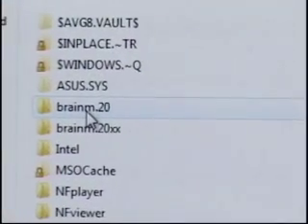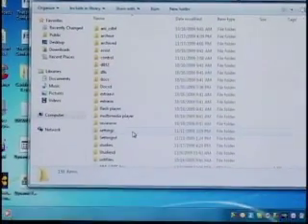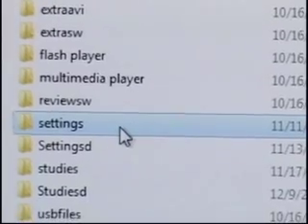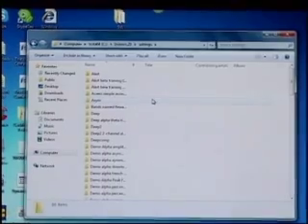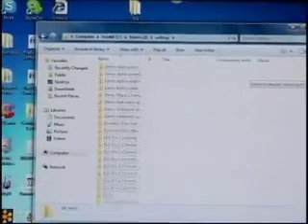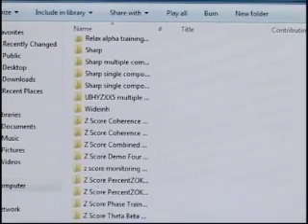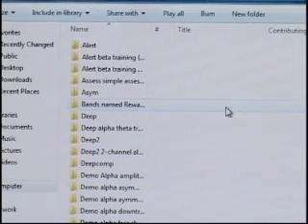BrainM20. The way I like to do this is to go to settings and glance through the list here. Because there are all kinds of different training protocols, I look at it as, why not just take them all and put them in the library in Discovery?